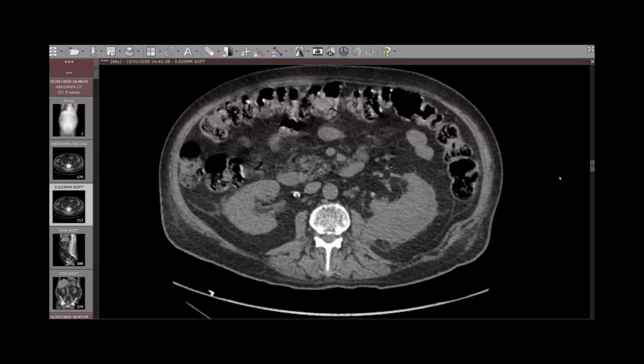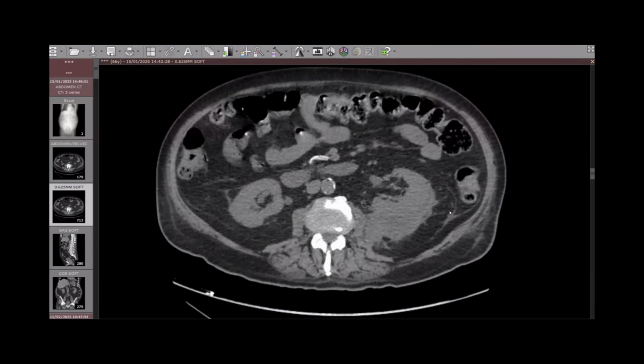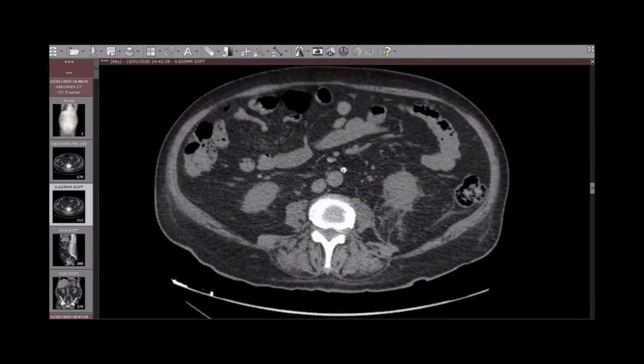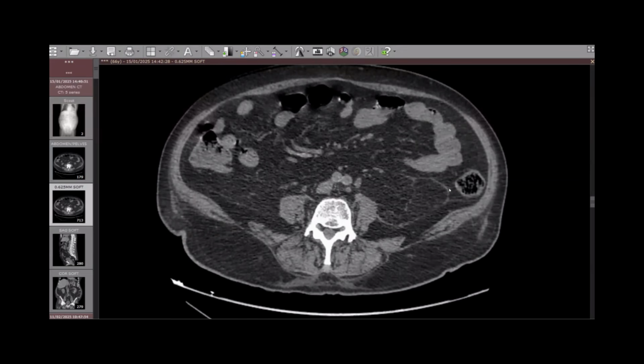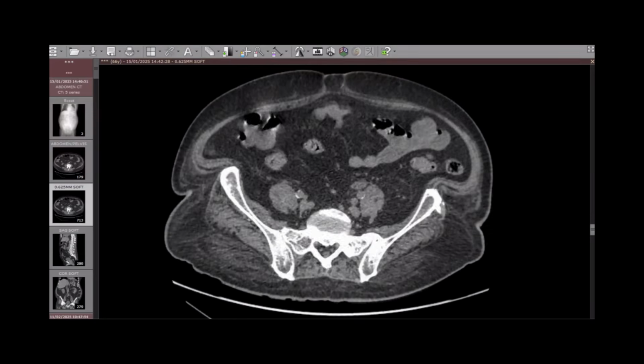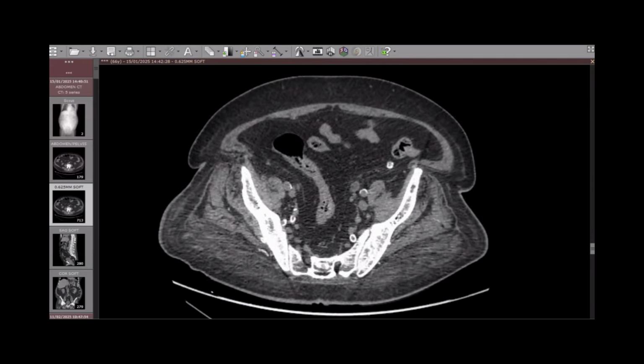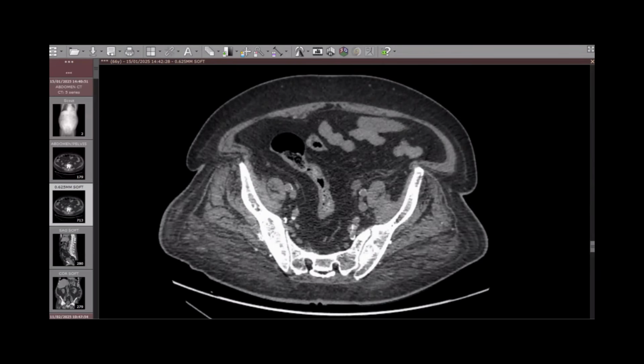Also, this one is the anterior fascia and this is the posterior fascia. If we scroll down, you will find this anterior fascia and this posterior fascia converging and uniting together to form the common interfascial plane. Okay, look for this plane, this area. In front of this plane are peritoneal structures. Behind this plane are retroperitoneal structures. Okay, this is a common interfascial plane.